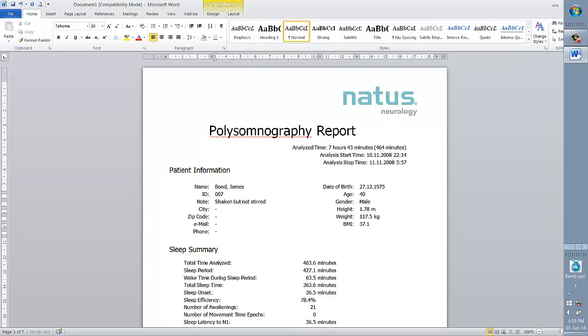Okay, so next up, I'm going to show you the business reports that Enterprise can generate. If I click here, you can see that there are a lot of reports that we can generate for the sleep lab. Because this is a set of demo data that I have for my webinar, I will generate the report from the year 2013 to show you what the Enterprise can do.